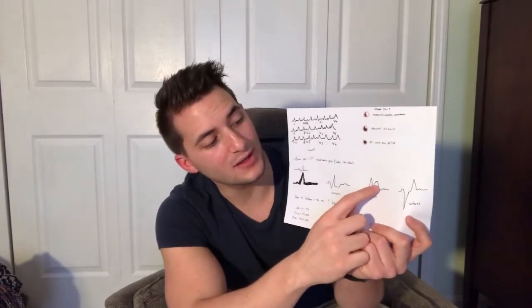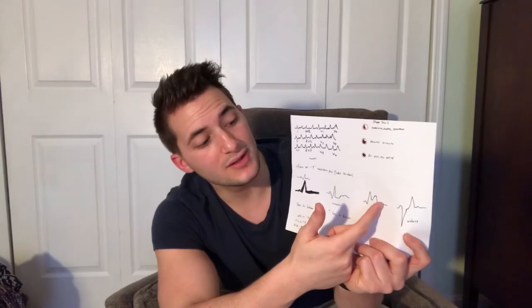Ischemia, injury, infarct will make sense in a little bit. And then here we have real big ST elevation, right? Big ST elevation. So here we are, QRS. We're looking for that J point, and it's so elevated here, and I did exaggerate this a bit. I saw this with a very experienced nurse, and she's someone I highly respect, because she said, we need this taken care of right away. So this is severe ST elevation. You see here, the T to the P is so much lower than it, right?